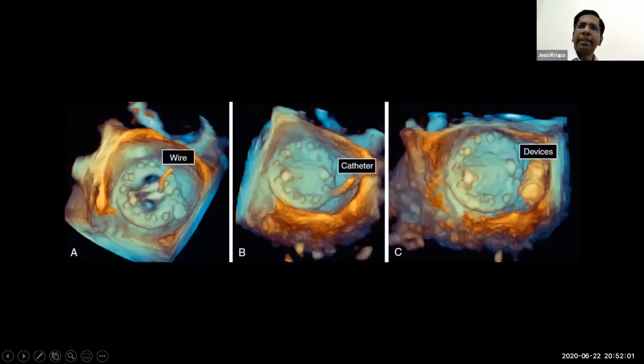So the TE and 3D TE also helps guide the paravalvular leak closure and also localization. So this also would be something like a posteromedial defect, something similar to what we saw in our patient. So this is also in the 3 o'clock to 6 o'clock range. And if you want to be more precise, this is exactly around 4 o'clock position.